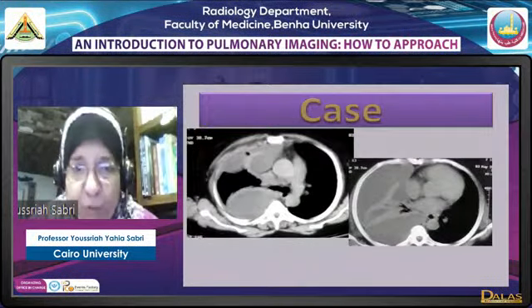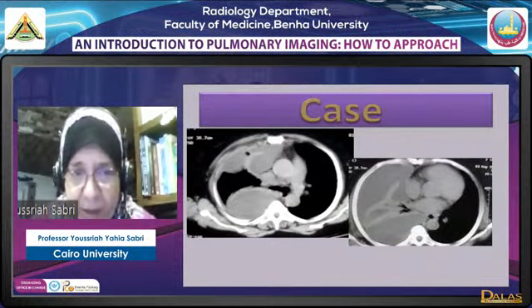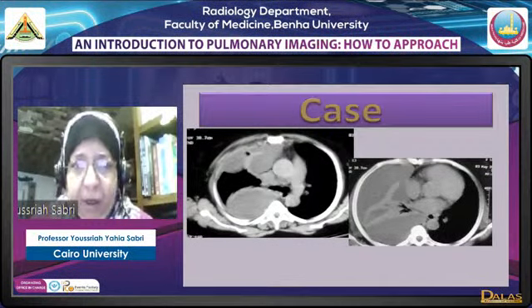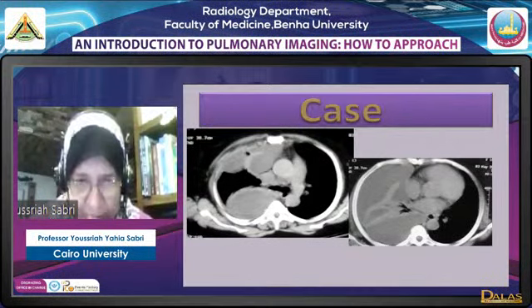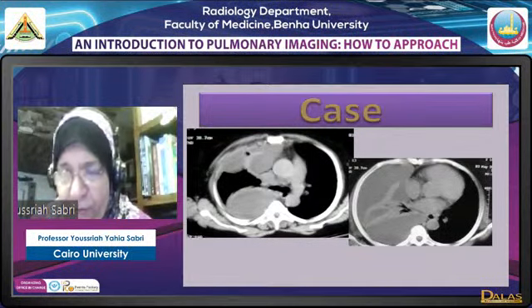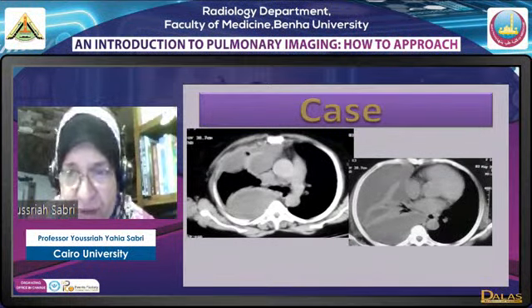Now here we have two images of the same patient. Of course, the right side image, as you can see, has loculation, which is so clear, and even a dense pleura, while the remaining effusion basally is free. And this is something that you see a lot, partial loculation of an effusion. And here we have a contralateral shift of the mediastinum.